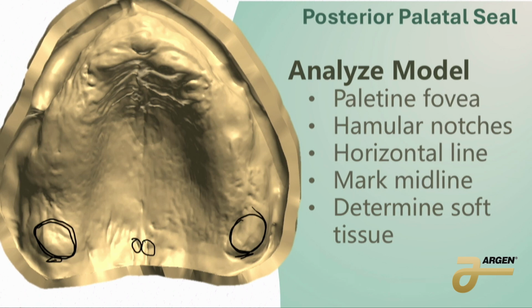If you put your tongue behind your last tooth and you open and close your mouth a little bit, you'll feel it. You'll feel it kind of going up and down, the muscle right behind your last tooth. So if we go too far back, that's going to pop that denture down. So we want to make sure we're trimmed right up to that hamular notch. So from there, we're going to find our hamular notches. You're going to draw a horizontal line.